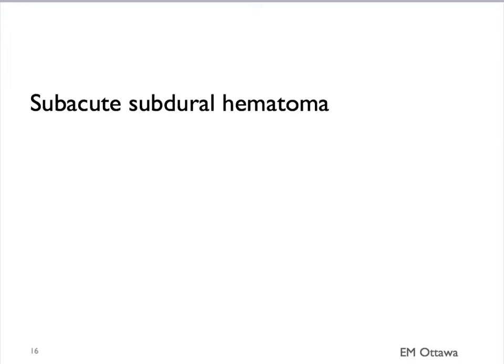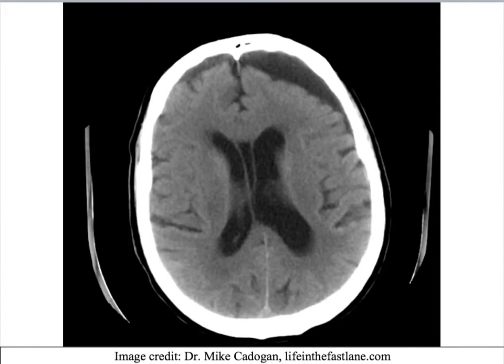Remember, for subdural hematoma, since the bleeding is venous, it tends to be slow. With the gradual accumulation of blood, the patient may not be investigated until much later after the initial bleeding has occurred. Therefore, if you were to investigate a patient who has had a 2-week-old subdural hematoma, the CT scan might look like this. You can appreciate that we do not see any bright white.